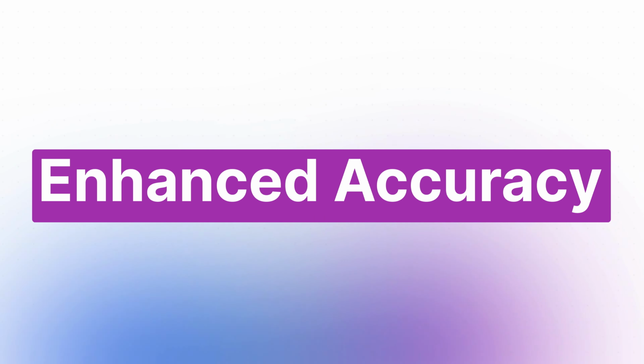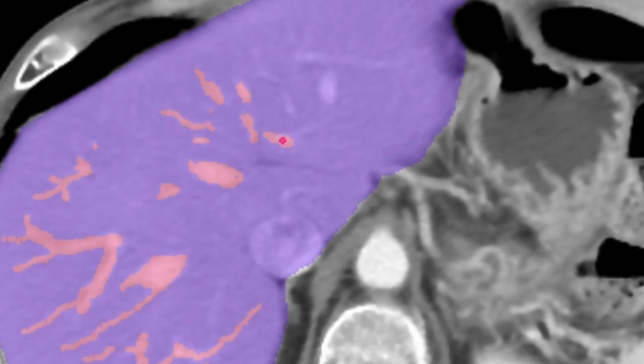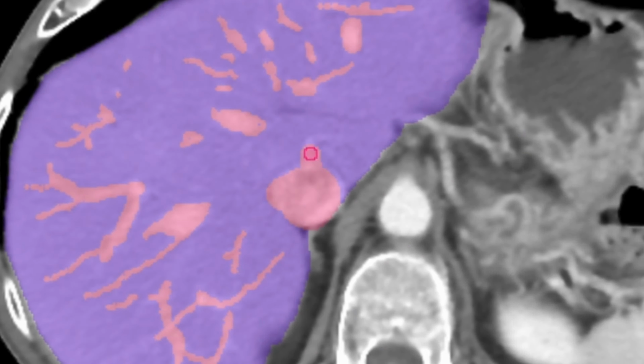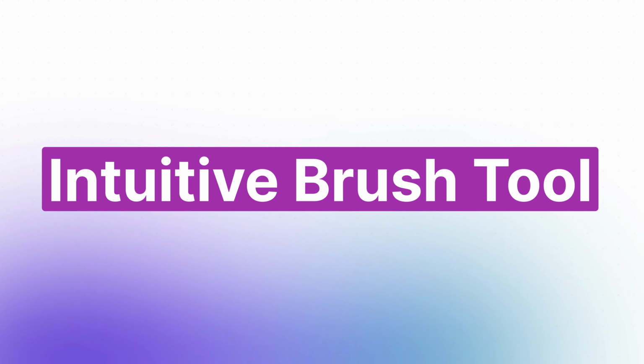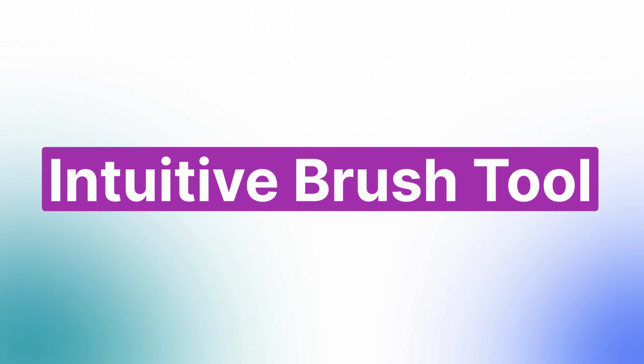Second, this new feature enhances accuracy. Masks offer precise pixel-level labeling, reducing ambiguity and improving annotation accuracy. Finally, V7's intuitive brush tool allows for quick and easy editing, saving time and effort in the annotation process.